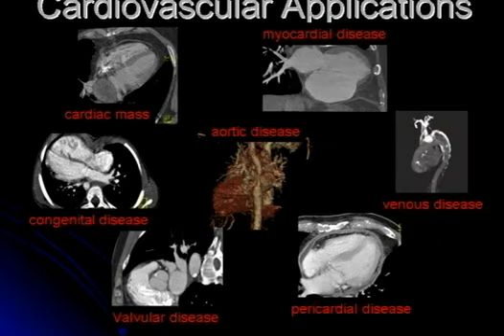However, there's much more to the heart than just the coronary arteries. And Dr. Jacobs touched a little bit on other cardiovascular applications, and I'm going to go just a bit more further into detail on these other areas of looking at the heart structure.